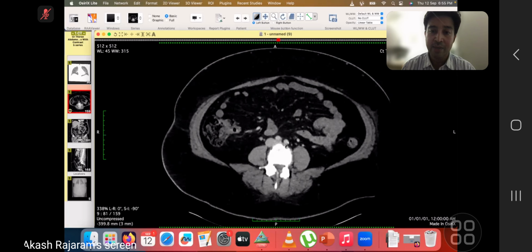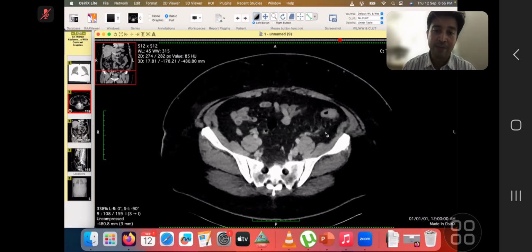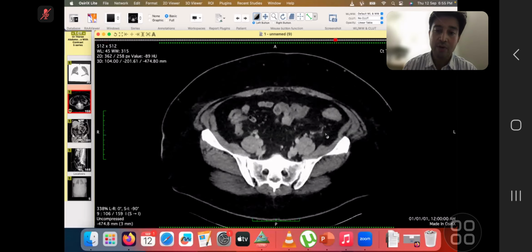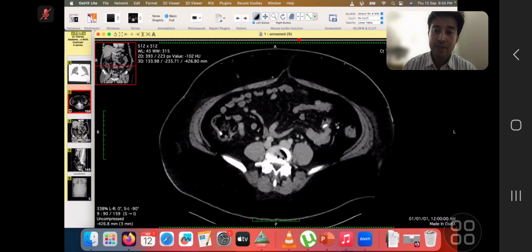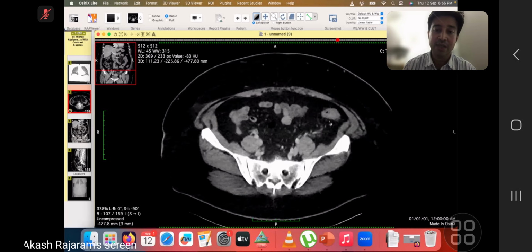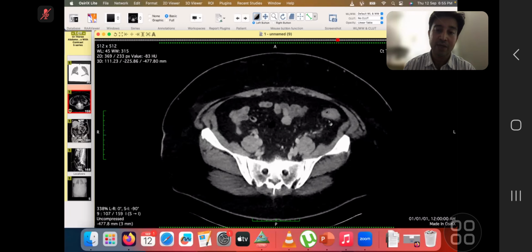You said, yeah, the inflammation has gone. Luckily, this patient came back with some non-specific symptoms, and we did suggest a follow-up, and the patient did not have any fat stranding. But you see there is circumferential soft tissue enhancing thickening of the descending colon. So this was actually a malignancy of the descending colon, which was mimicking diverticular disease.